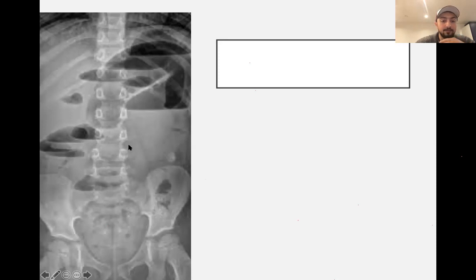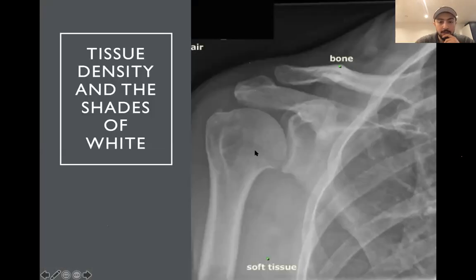So if you see more than five different fluid levels, then it's probably caused by bowel obstruction, either large or small. If you have any questions, feel free to ask me or let me know. You can't really see the large or small colons in here, but it's very important to keep an eye on this characteristic finding, as it could indicate obstruction.